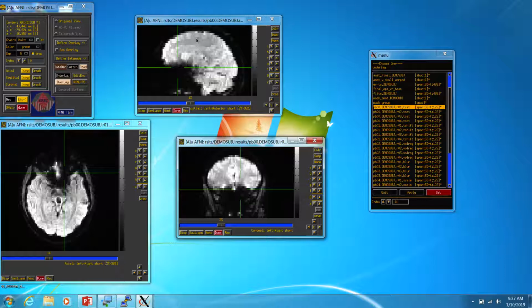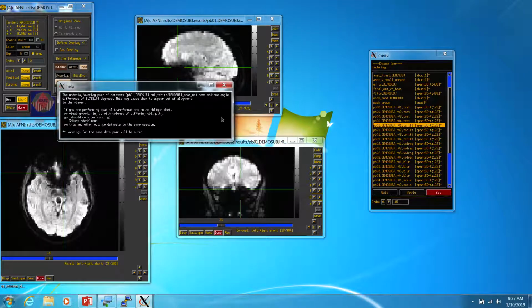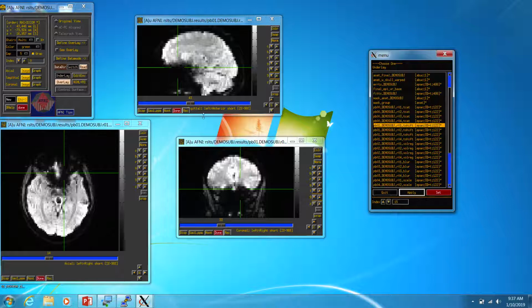Our pre-processing steps help account for this, but it's important to know that that's an effect in your image. Okay, so what it did right here is it basically concatenated everything. In our next step, we end up applying our time shift. This one didn't have a lot of motion, but sometimes when they're concatenated together, you get kind of a striation in the brain. That's because each of the slices happened at a different time. This T shift helps basically align all the slices so that they're occurring at the same time and they're balanced.